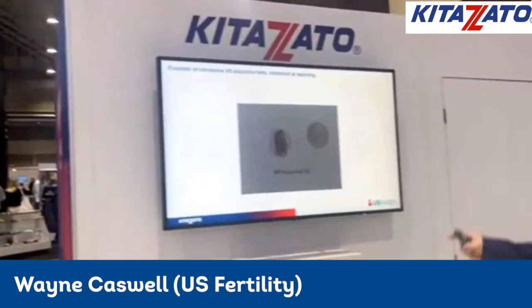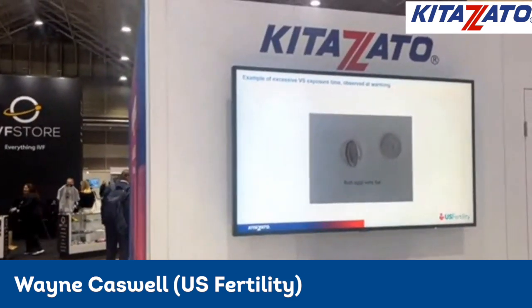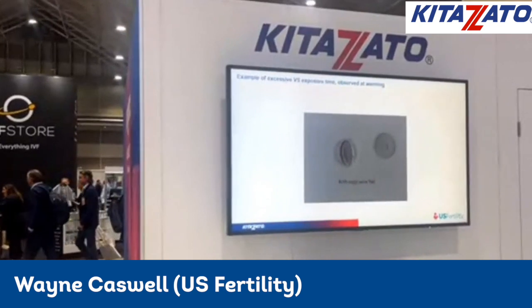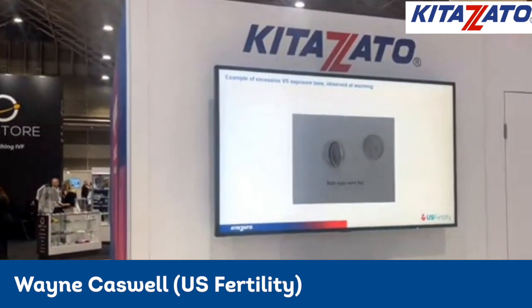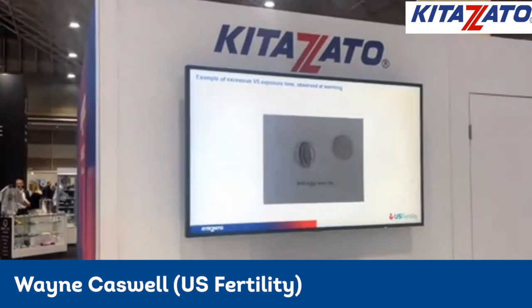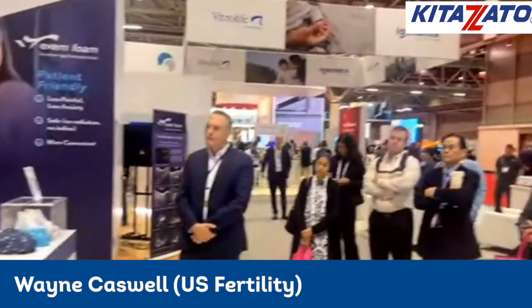This is an example of oocytes that on warming were flat. So it looked like they were stepped on, and they don't recover at all. This is an example of excessive VS exposure. So what can be excess VS exposure? Well, you were in there for more than a minute. That can be a problem. But it's also really due to loading technique.